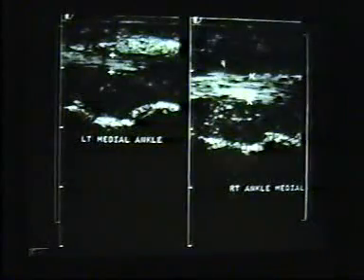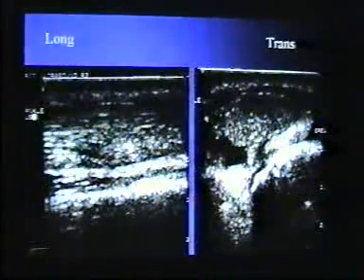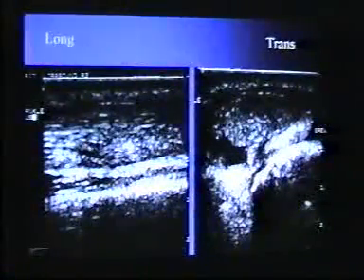Cross section, you can see the inflamed tendon along with fluid in the sheath. This is again thickening of the tendon, which is tendinitis, along with fluid. It is tenosynovitis. Then coming to tendon tear. A tendon tear will have discontinuity. It can be confirmed, we can have correlation on surgery. This is the defect at the tendoachilles. This is transverse and longitudinal.